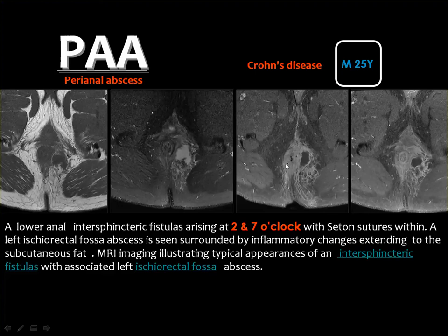They represent a tube, and this tube is known as a Seton tube. And this tube is actually very useful in the management of anal fistulae, and I will mention its exact function.